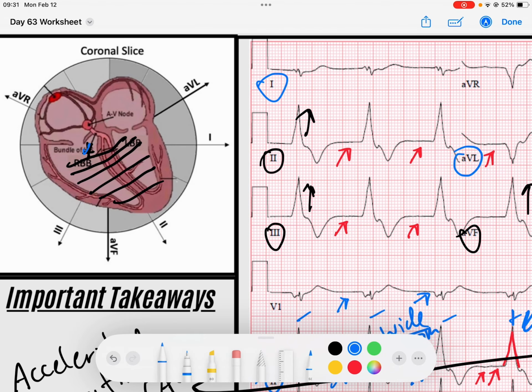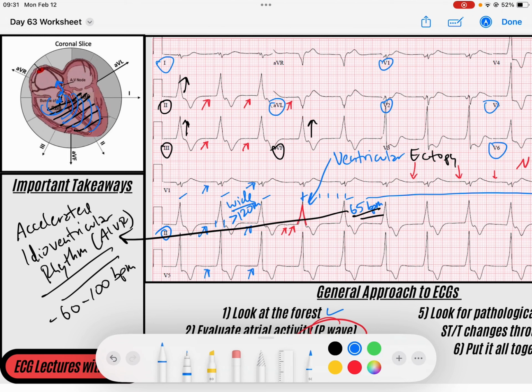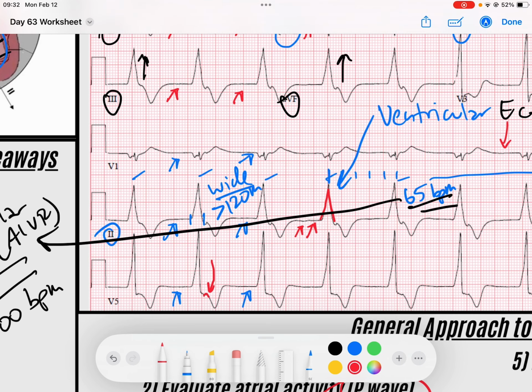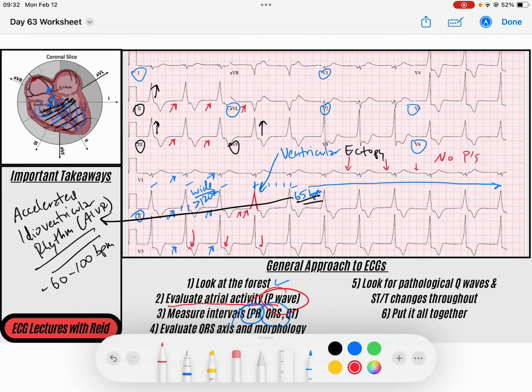This focus is going to depolarize the ventricles all throughout the ventricles, and sometimes can send signal up the AV node, and that's kind of patient dependent, and it depends on the health of their AV node. It also depends if they have the pathways that are compatible with that. Sometimes after the QRS, you can actually look for retrograde P waves, and maybe we have some. If you look here, maybe that little notch just after the QRS, potentially that could be representative of a retrograde P wave.